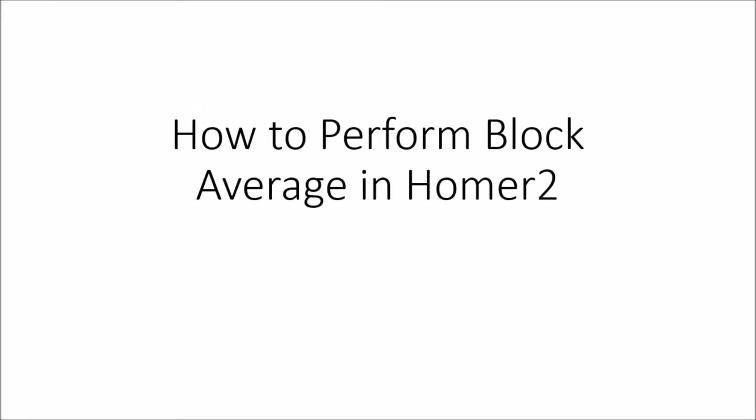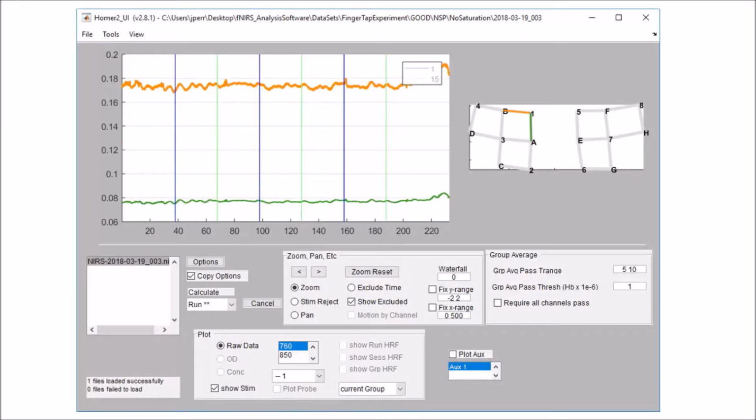Hey everybody, I'm going to put together a quick video on how to perform a block average in Homer2 and describe exactly what's going on in the background. So here's your data. This is a motor task.